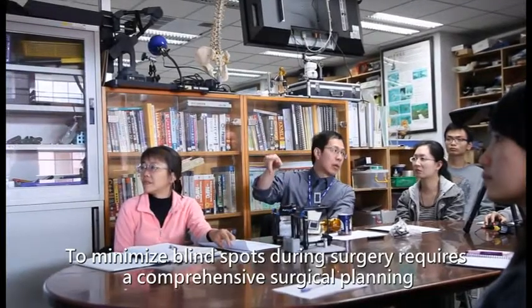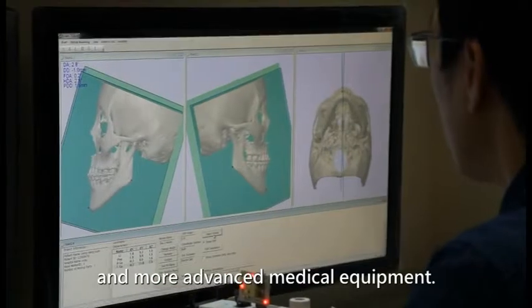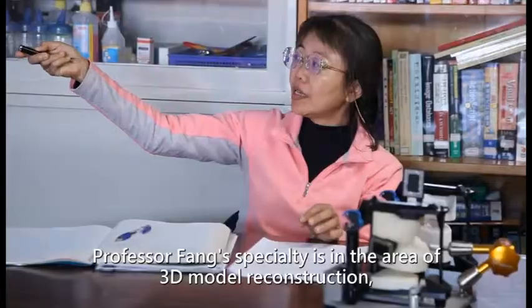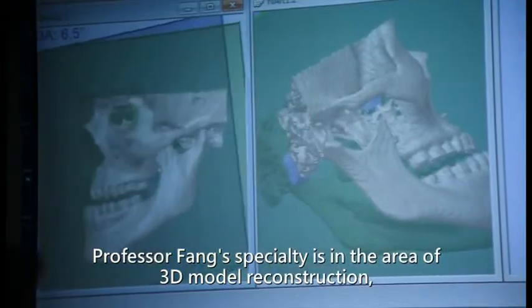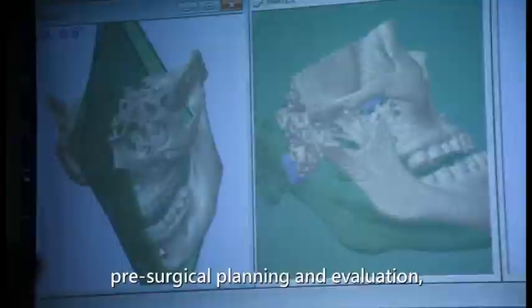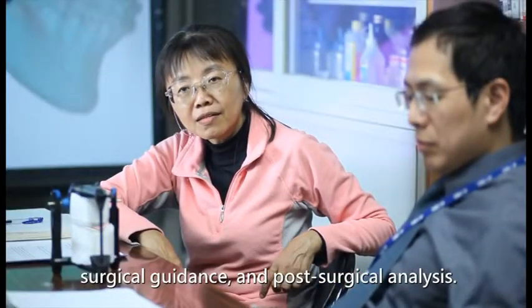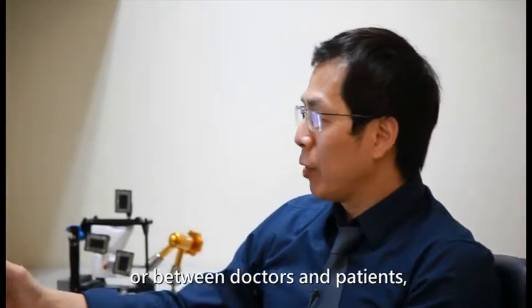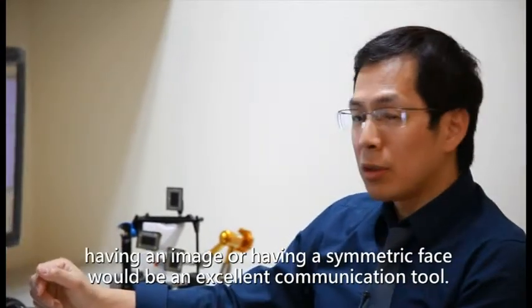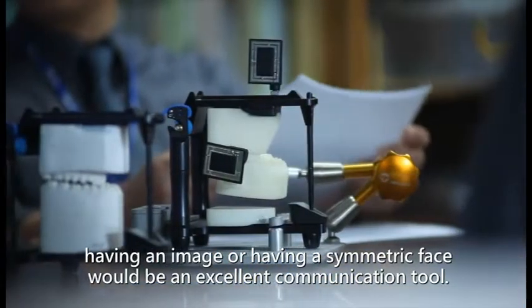Minimizing blind spots during surgery requires a comprehensive surgical planning and more advanced medical equipment. Professor Fang's specialty is in the area of 3D model reconstruction, pre-surgical planning and evaluation, surgical guidance, and post-surgical analysis. In terms of the communications among doctors or between doctors and patients, having an image or having a symmetric face would be an excellent communication tool.